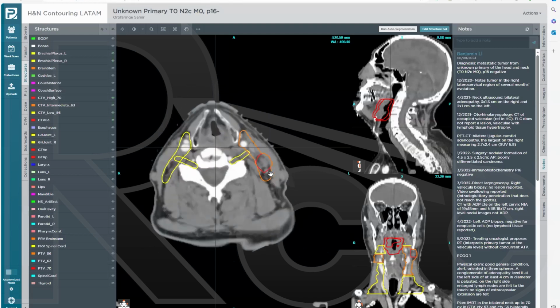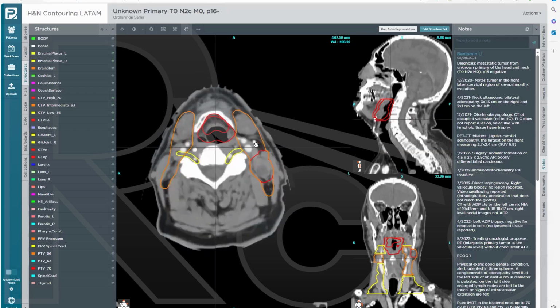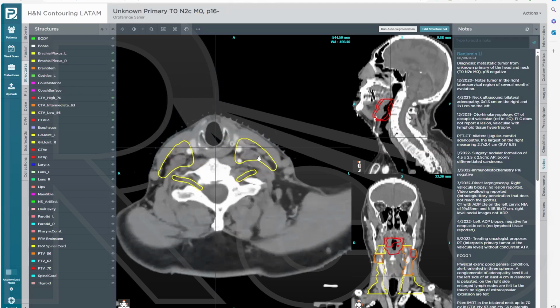And this also is a question here, like this is a lymph node where you're seeing the question of maybe is there invasion of the sternocleidomastoid muscle? It's not clear, but maybe, or there's some concern of extranodal extension. This is where you can cover and treat the sternocleidomastoid muscle and include that in your CTV. And then here we have contrast, so that's a little bit more straightforward to see.